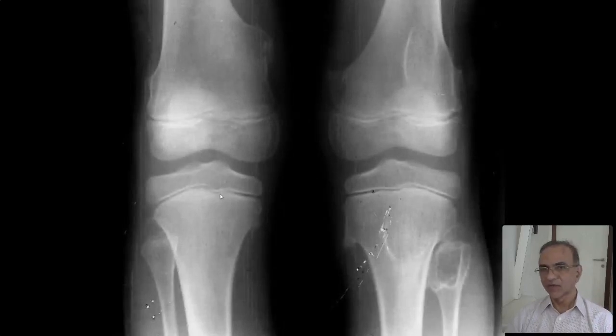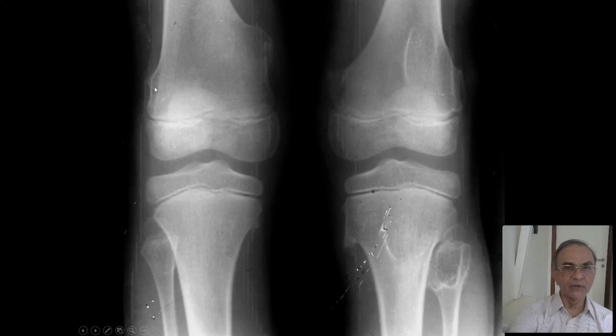Now, this is what I said. I'm testing you here. Abnormal looking bones. What you see here is a small bump here. What you see here is a bump. What you see here is something oval. So this is the end-on appearance of something like this. Imagine this from this view. For example, sometimes you see just this. Lower end of the femur.